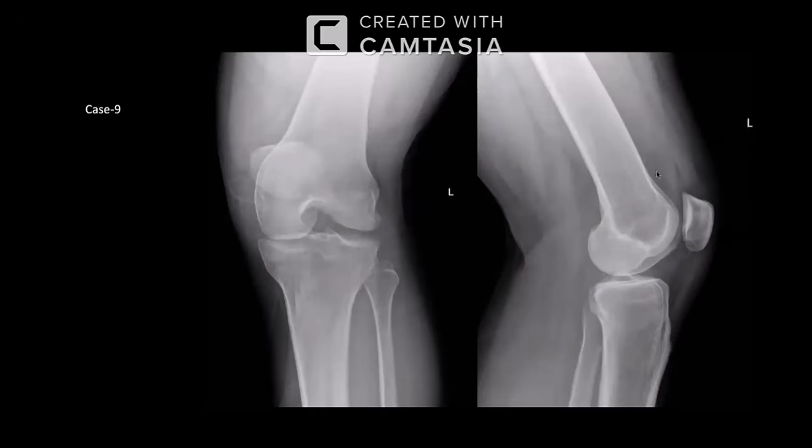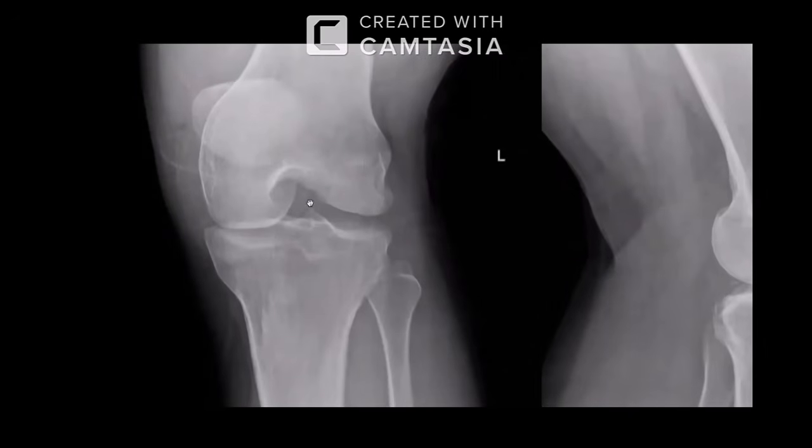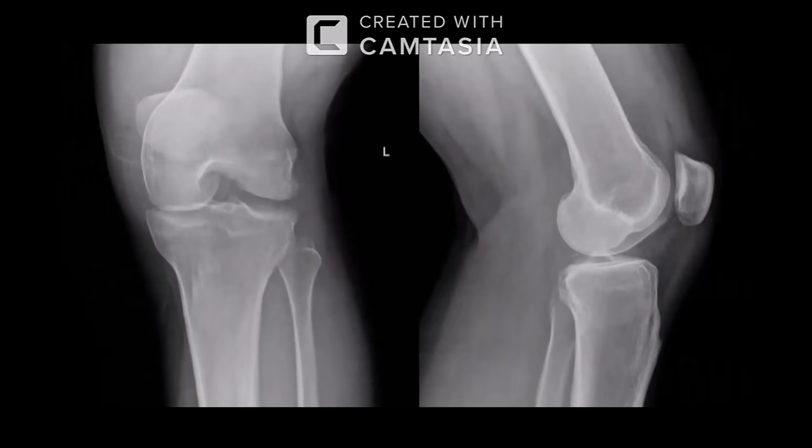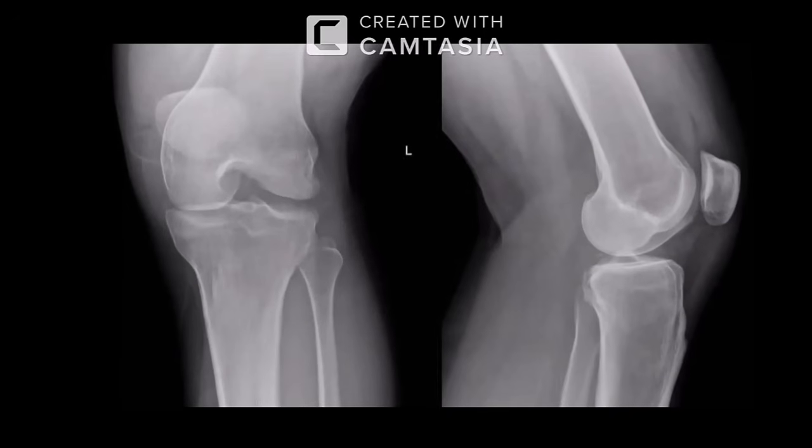So yes, there is definitely suprapatellar joint effusion. And the other aspect, I think something you mentioned in the intercondylar notch, there is nothing in the intercondylar notch per se. Otherwise, yes, this intercondylar area appeared asymmetric to me. So I think it is projectional. Oh, the intercondylar, okay, yes, definitely. That's just the projection, and no other fractures that we could appreciate on the plain radiograph.